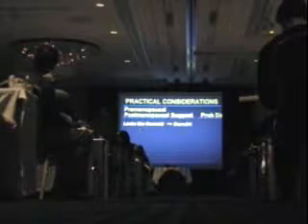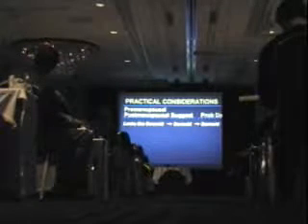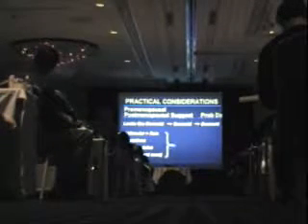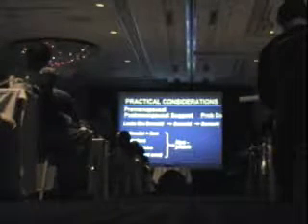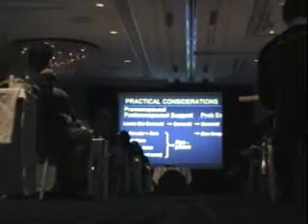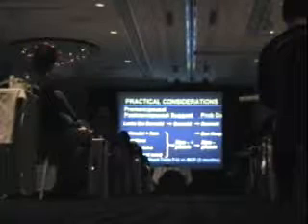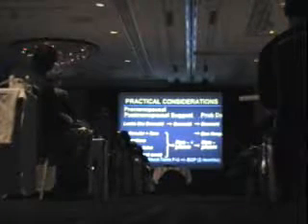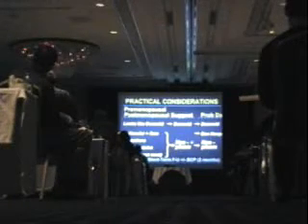If something looks like a dermoid, mostly they're premenopausal, but even if postmenopausal, you're probably going to be right, it's a dermoid. If it's unilocular, now we're talking about postmenopausal women, and it's greater than 5 centimeters, if it looks simple, it's probably going to be a benign lesion, but you can't be sure. And if it looks complex like this, if you're going to do follow-up at all, make it short-term follow-up, not more than 2 months or so. If it's unchanged, it should come out. And some people would say it should come out with that appearance, primarily in a postmenopausal woman.